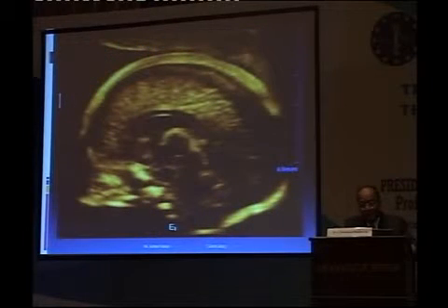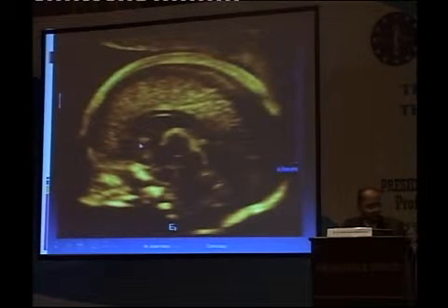And in many cases, it's not easy to put a cursor between the outer or the interface between the corpus callosum and surrounding brain tissue. But it is much easier to put a cursor between the hypoechoic or lucent cavum septum and the surrounding echogenic corpus callosum. And this is the idea of our study.